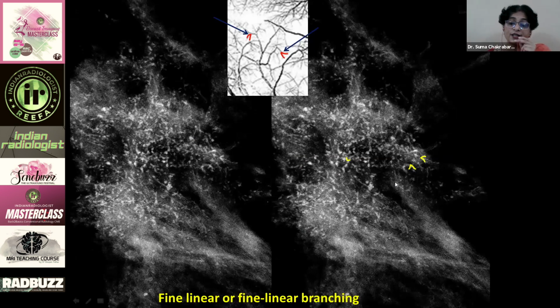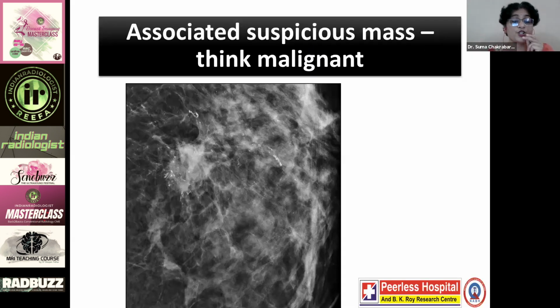branching calcifications that we have in this last category, which is BIRADS 4C, which means it is on its own a very high risk calcification to have in the breast. So if you see the V's and the Y's within the calcification, similar to the branches in the trees, that means that this is definitely ductal calcification, and the Y's and V's prove beyond any doubt that these are ductal and they are traveling along the duct. And this is in terms of morphology the worst type of calcification.